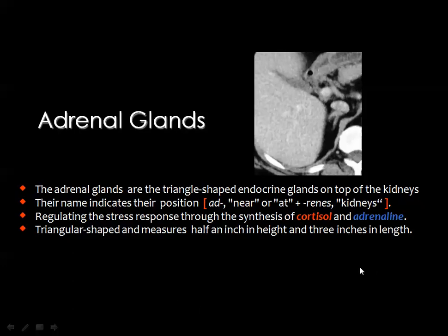You know that the word adrenal means that the structure is adjacent to the kidney, and this structure is evaluated by ultrasound, by CT, and also by MRI.